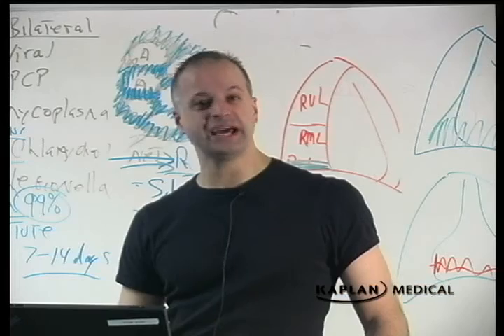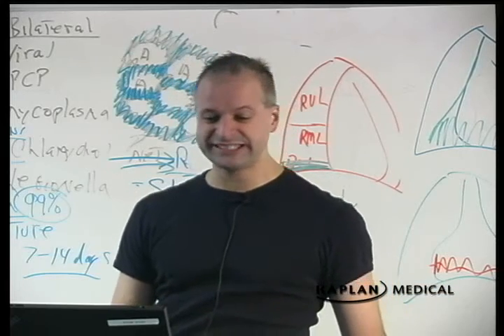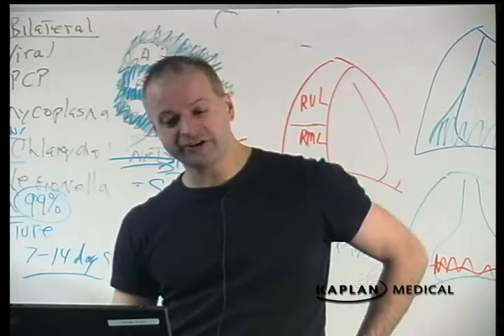This is an upper GI series, a barium swallow. This is barium. This is the pharynx. And what is there with a Z at the back of the pharynx? Zoo, zoologist, xylophone, no, that's an X. Zenker's, yes, there's not that many things with a Z in the back of that pharynx. That's a Zenker's diverticulum outpocketing in the back of the pharynx.